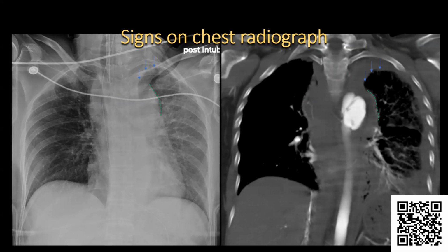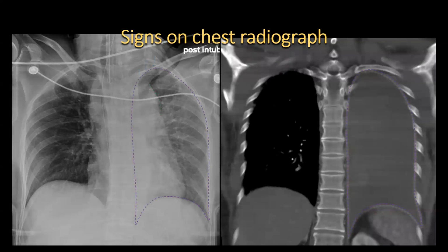This is because a potential space exists between the aorta and the left lung parietal pleura. Blood from the aortic injury tracks cephalad along the course of the left subclavian artery between the parietal pleura and the extrapleural soft tissues, resulting in an extrapleural apical cap. The veil-like increased density of the left hemithorax is due to layering hemothorax in the supine position.